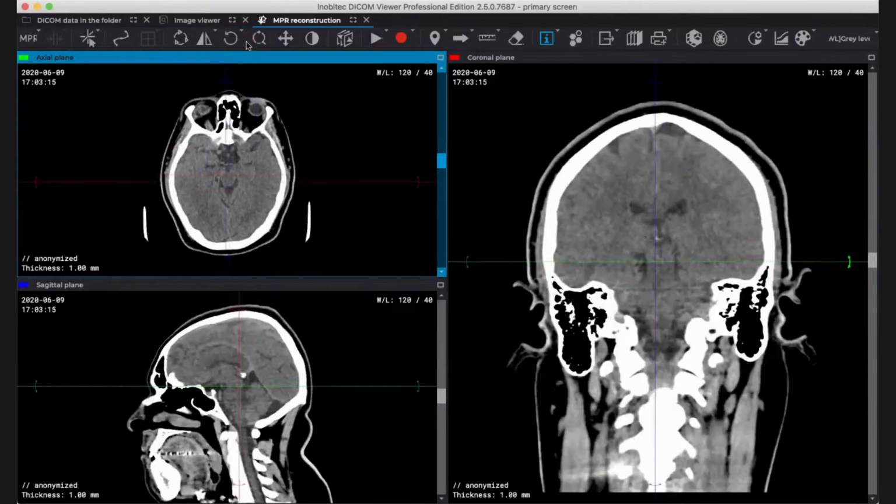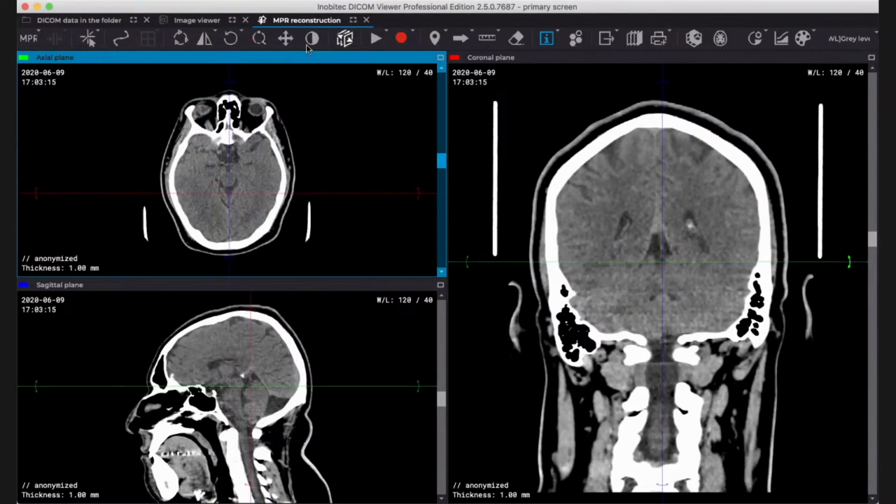And one of my favorite features about this software is that you can personalize your settings. So your mouse and your different buttons just do whatever you are most used to in your everyday work. Here I am using, I don't know if you see my screen, a wheel mouse, which I strongly recommend when you are working with 3D images and segmentation, because it's very easy to work with a mouse rather than a keyboard, okay?